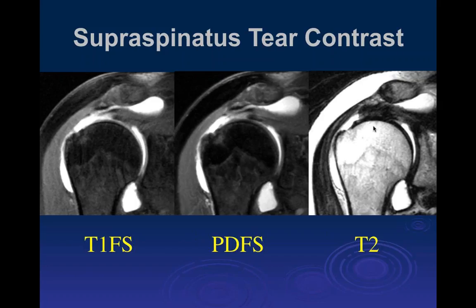So in the end, after you go in and remove non-viable tissue, the tear actually may end up being significantly larger than the defect we see at this time. So we can just estimate that. I don't think MR is really good at determining how much you might have to remove here. It's better with the meniscus and the knee. But at least you can let the surgeon know that there is about 1.5 centimeters of the distal end of the tendon has significant degenerative changes.